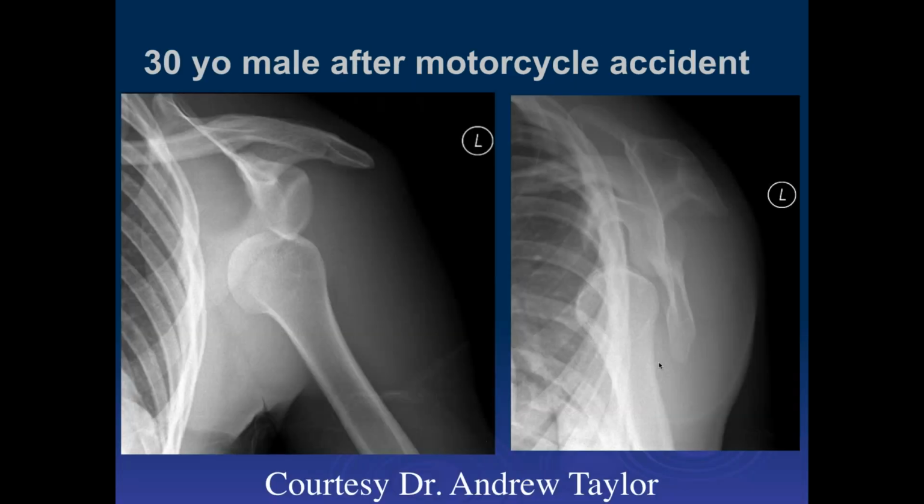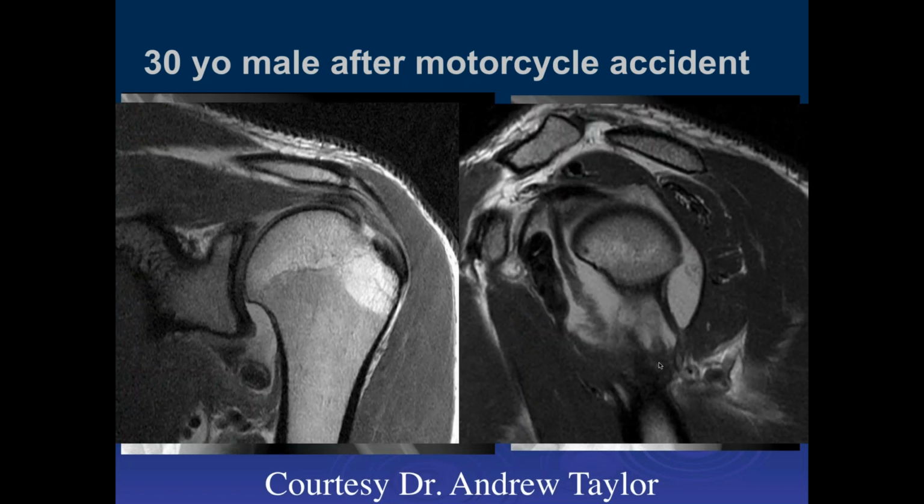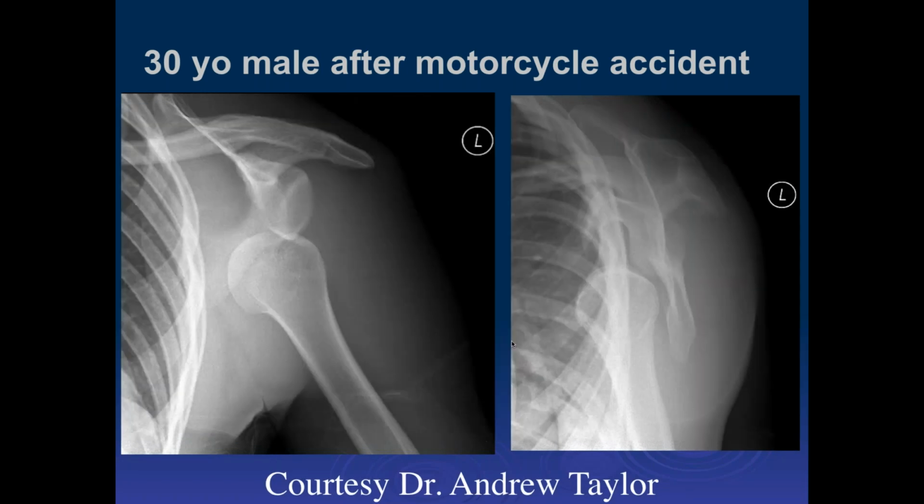On X-rays, this, John? Motorcycle? This one is. This is a different patient. And the MR scan after they relocated this patient.